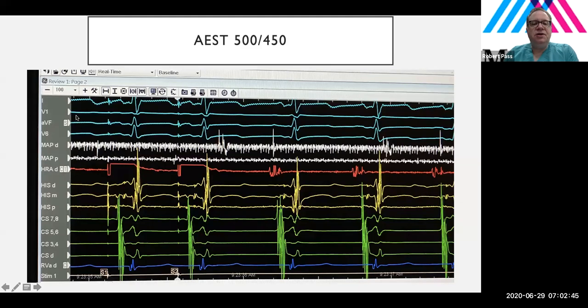But almost always, most electrophysiologists will display the surface electrocardiogram at the top of the screen. And as I'm fond of telling people, it's always useful to look at the ECG when trying to understand what's going on in the intracardiac, because, of course, the EKG is what we're used to looking at. Of course, we're at 100 paper speed, so it's 4 times as fast as usual, but that's intended to demonstrate the relationships of these intracardiac intervals that are very close to one another in milliseconds.